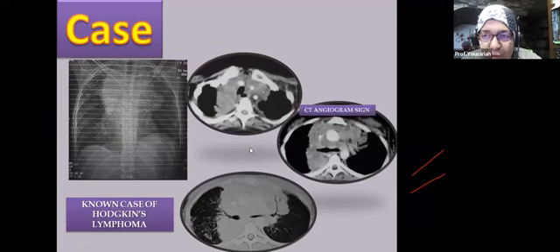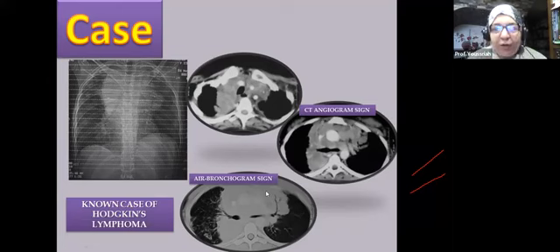Now we have here two very interesting signs. The CT angiogram sign, the vessels inside the lesion, and the air bronchogram sign. Well, actually, the people know this patient has a mass in the mediastinum. They needed to know if this lesion extends into the adjacent lungs.